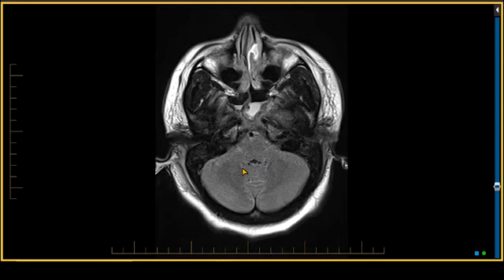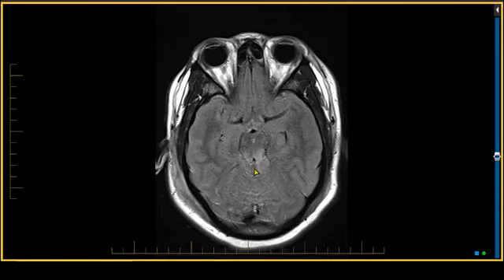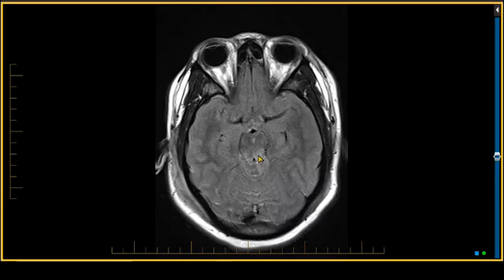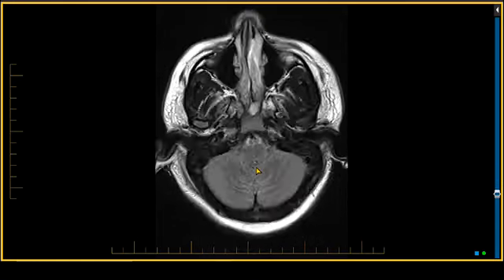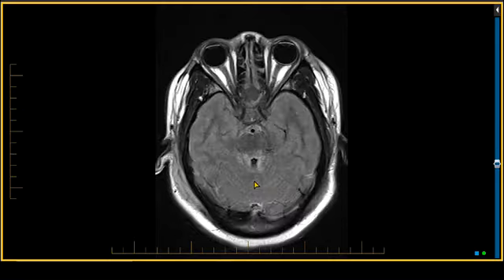Remember that I said that an acceleration-deceleration injury site of pathology includes the posterior midbrain as the brain goes forward and back and the midbrain bangs up against the hard dural margin of the tentorium. This is what you are seeing here in the midbrain, more on the left than the right on this FLAIR scan. You note that even in the posterior fossa, the vermian subarachnoid space is bright on FLAIR scan, which is abnormal.